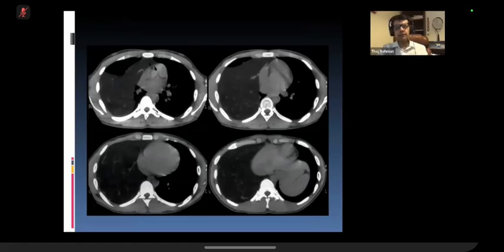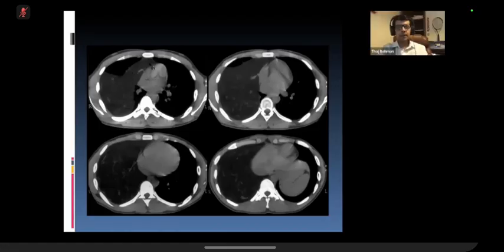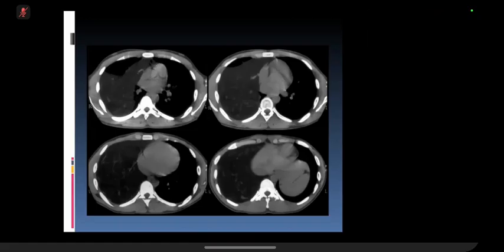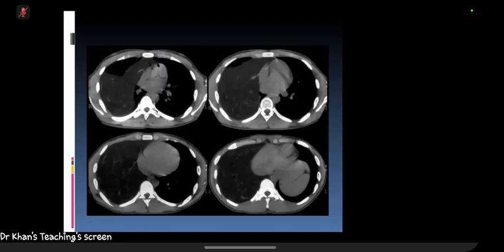This is a rare condition. It's not a common condition that you can make a diagnosis. The point that I want you to understand is that the lesion is attached to the space anterior to the heart here. That is the space occupied by? So the anterior mediastinum, so it can be mediastinal lipomatosis. Right. I mean, this space anterior to the heart is occupied by what structure? Anterior to the heart?